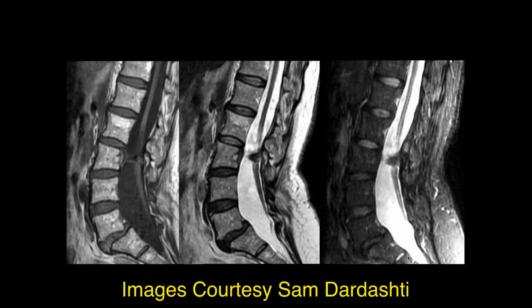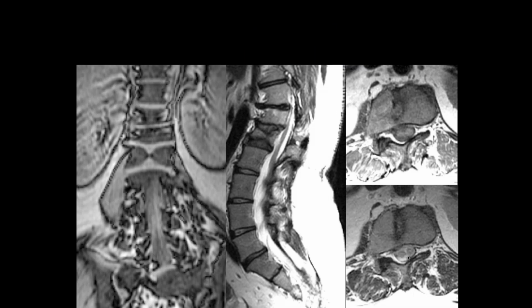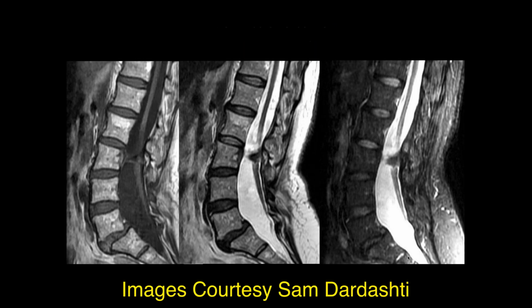What level is that, John? I think this is L1. I thought so. So 1, 2, 3, 4, 5. Okay. The conus is inferiorly placed. The conus is tethered to the posterior elements. Yep. Right. This is not a very good condition to have.